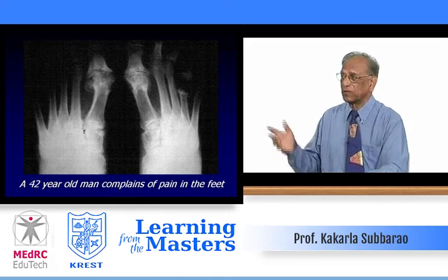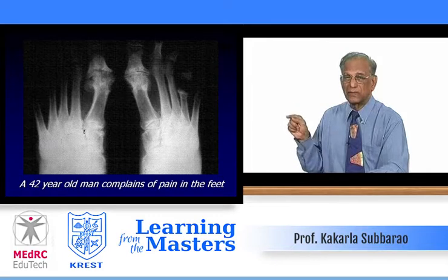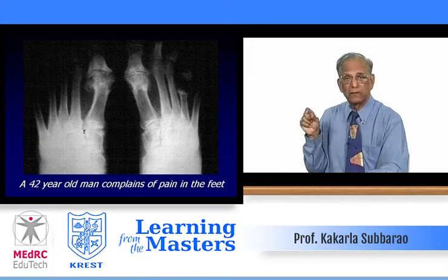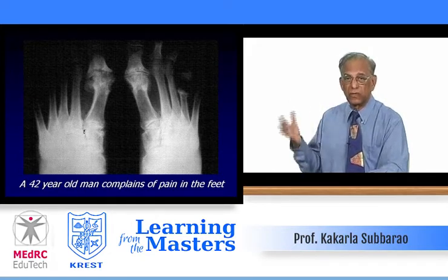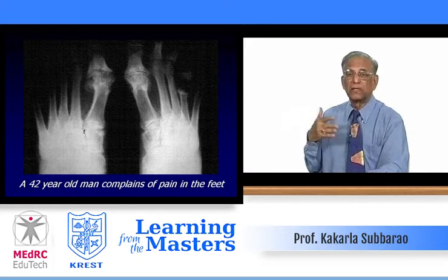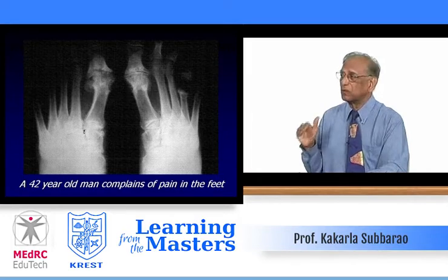No periosteal reaction either. And then if you look at some of those, especially on your left, first metatarsal head, on the medial side, there is a punched out area with overhanging margins. That gives you a clue that it must be gout. But then in gout, cartilage is relatively spared most of the time. But occasionally, in advanced cases, you may get degenerative joint changes. In fact, we have seen cases where the diagnosis is made as degenerative arthritis. It is only secondary to the gout.